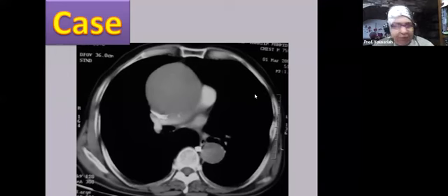Okay, let's go on. Bismillah ar-Rahman ar-Rahim. Now we have a dilatation of the aorta in a 75-year-old male patient. The focal dilatation of an artery, as I said, is an aneurysm. And being 75, its most likely etiology is atherosclerosis.